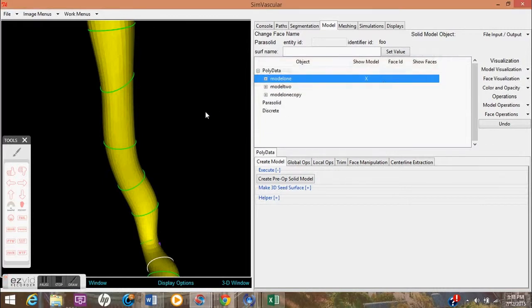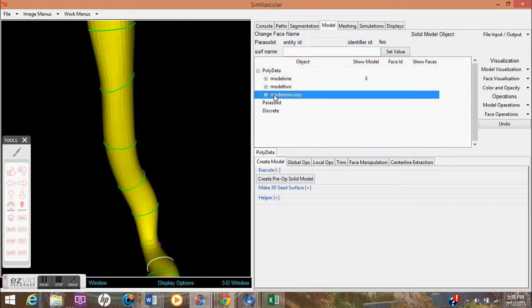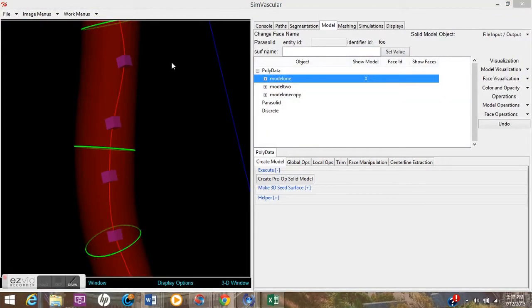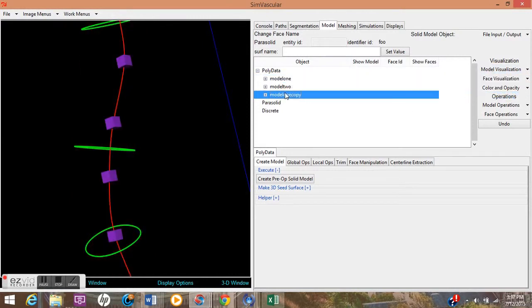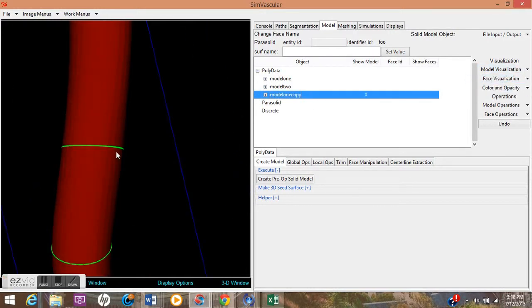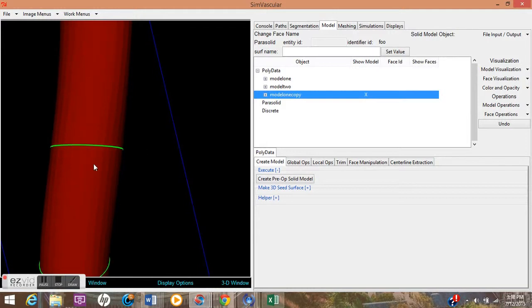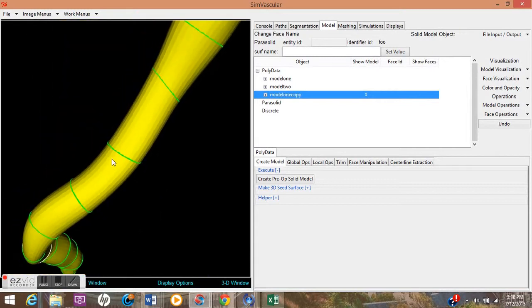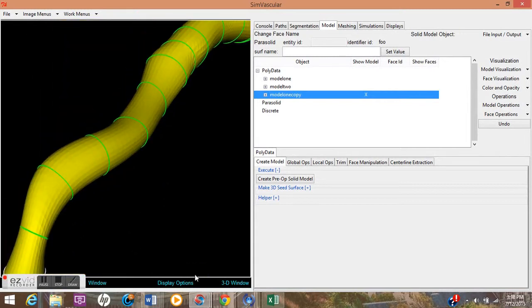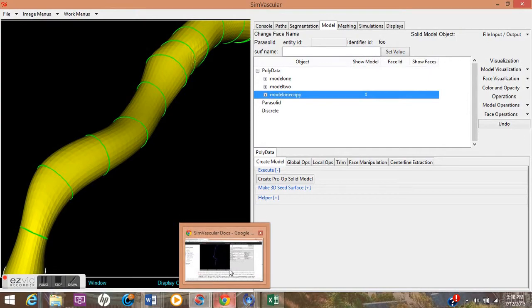Model 1 copy, and now we should see a completely smooth model. I'm going to say don't display this one, and show the Model 1 copy. And it's still got those lines. It should be completely smooth. I think I show in the tutorial, yeah, here I go.